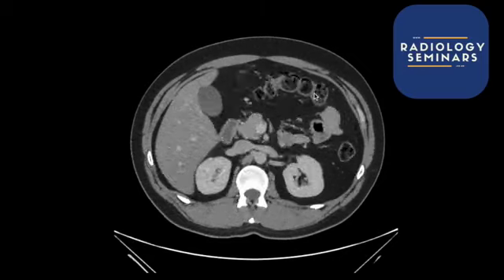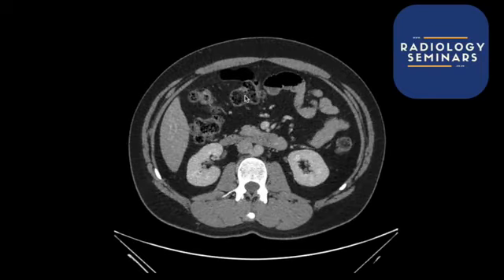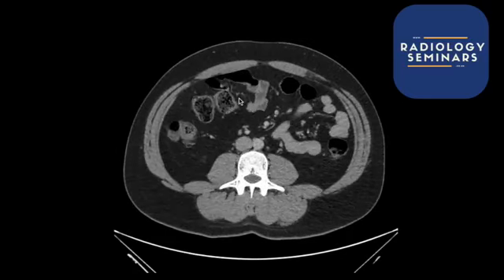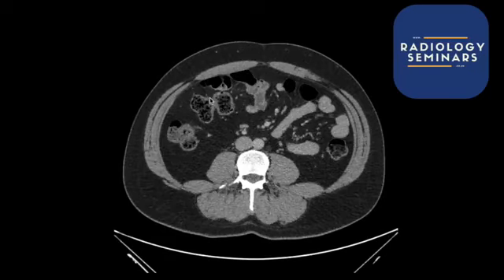Look, and go up and down just to see where it goes. Up and down. Look, there it goes. This way. Look, it's easier. Honestly, I remember when I was a reg, I used to watch my consultants do this, and it looked really easy. I was like, yeah, I'm going to do it too. And actually, when you're doing it yourself, for the first few times, it's really difficult and can take a while. And look, you want to follow this.